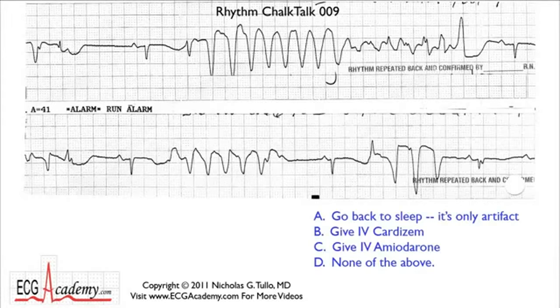What do you do? Okay, do you A, go back to sleep, it's only artifact? Do you B, give IV Cardizem? Would you C, give IV amiodarone? Or D, none of the above? So let's get to it.